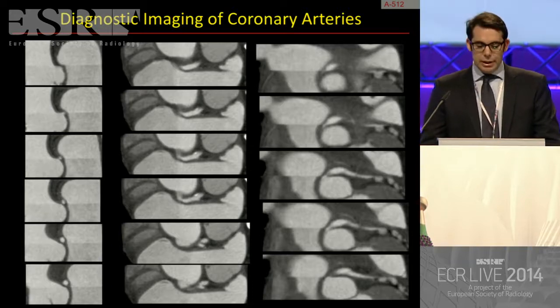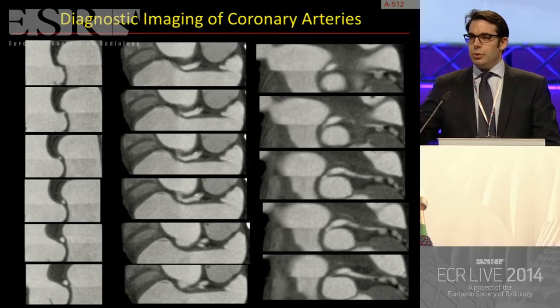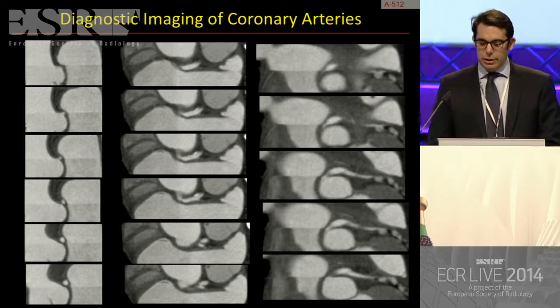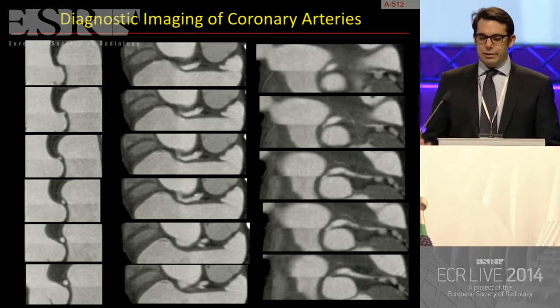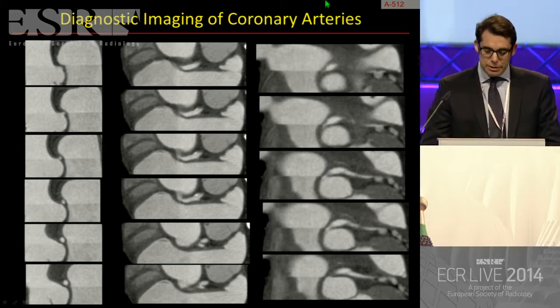So this wasn't a problem, as I said. This is another interesting case. Exactly this is what happened in this case. The person who did the angiography put the catheter too far, and suddenly there were some arrhythmias in the individual, so he just retrieved it and said there may be a stenosis. So they ordered a CT just to confirm whether it was or not. And of course, when there is such a critical question, if an artifact has to happen, it has to happen in that specific place. So this was a tricky case for us.